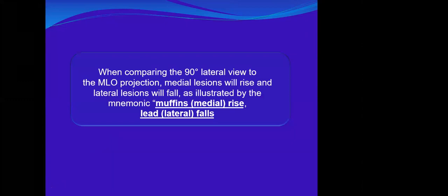And as we mentioned before, when comparing the 90-degree lateral view to the MLO, the medial lesion will rise and the lateral lesion will fall, as illustrated by the mnemonic: muffins rise and lead falls, or lead sinks. Muffins reflect medial and lead reflects lateral.